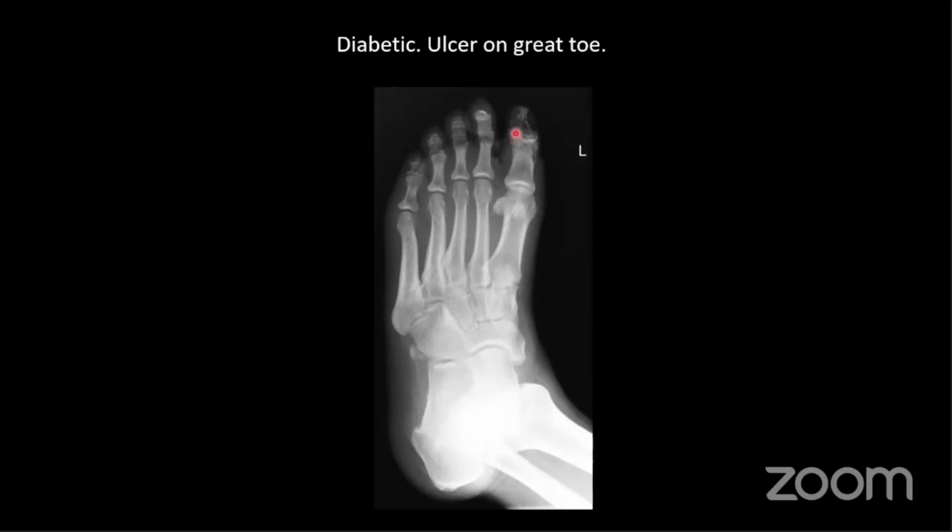In terms of CT versus MRI, CT is obviously very good at looking at bone. So you would see this bone destruction very, very clearly on the CT. But the most sensitive test is an MRI. MRI will show early inflammatory change and edema within the bone marrow before CT would show these cortical changes. Essentially, if you can see it on a CT, you probably see features on a plain radiograph, but the early changes of osteomyelitis seen on an MRI predate this.